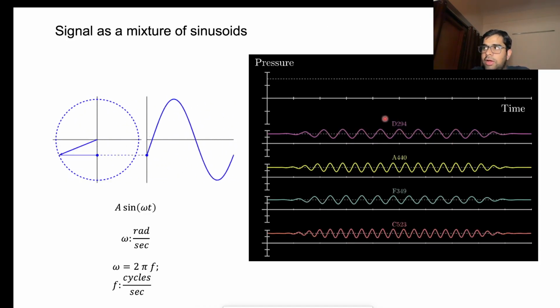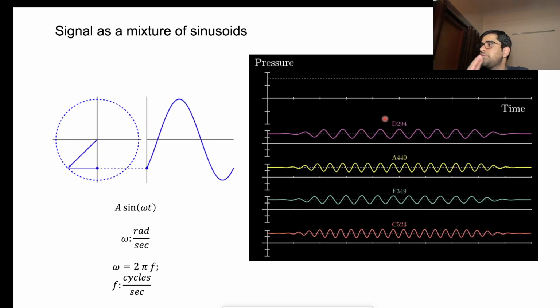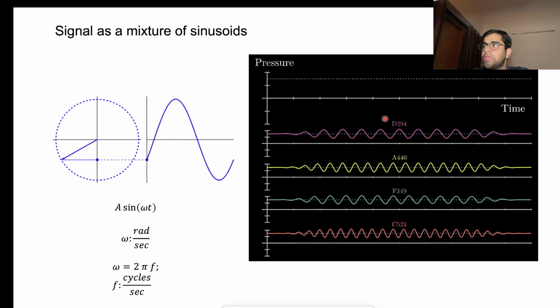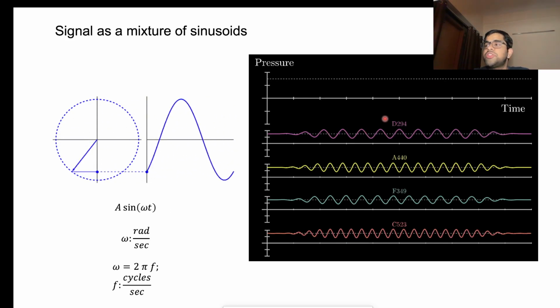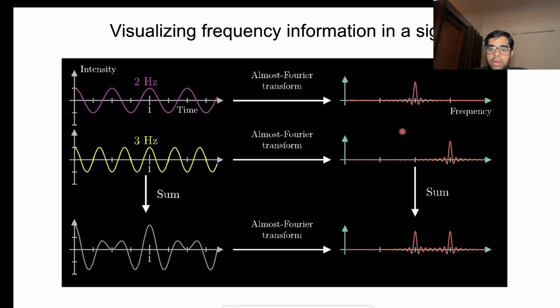Okay. So essentially both are the same. A signal, whether you represent it in frequency or time, is the same signal you're representing. So it's not giving any extra information. You can think of it as a visualization tool. So right now when I show you this, each of these signals you add up.